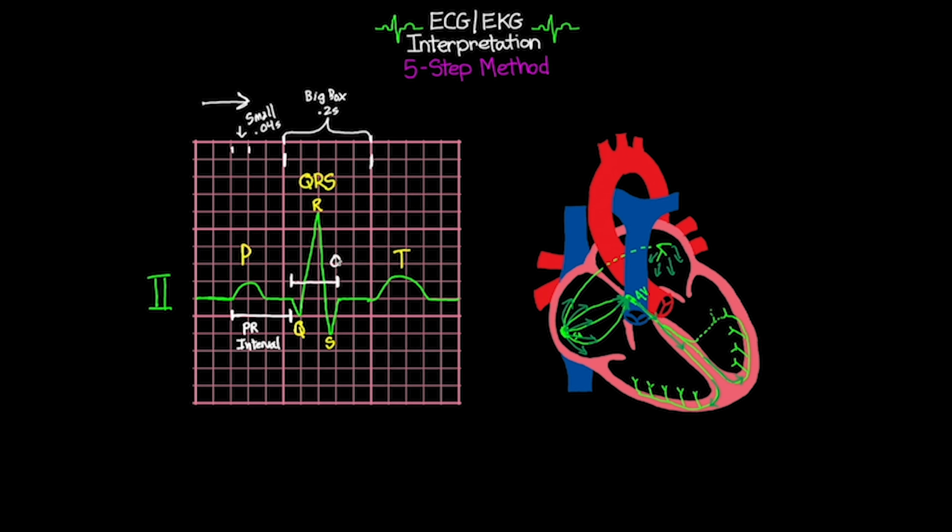And like I said, that's going to be measuring our QRS. Now, there is one last interval that I do want to point out and make mention of here, but we're not really going to talk about it much in this lesson. In fact, that's really going to be geared towards another lesson that we'll probably do in the future. But there's this segment right through here, which is our ST segment.